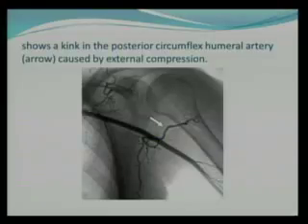So here, what do we see? So we see a small kink. Again, I wish I had a magnifying lens, but I think all of you can see. I want to stress on the fact that this is a shelf-like defect. It looks as though somebody's just put a little bar, or it's like a shelf, like a shelf of the house. Like it's just a small rectangular bar that is causing impression.